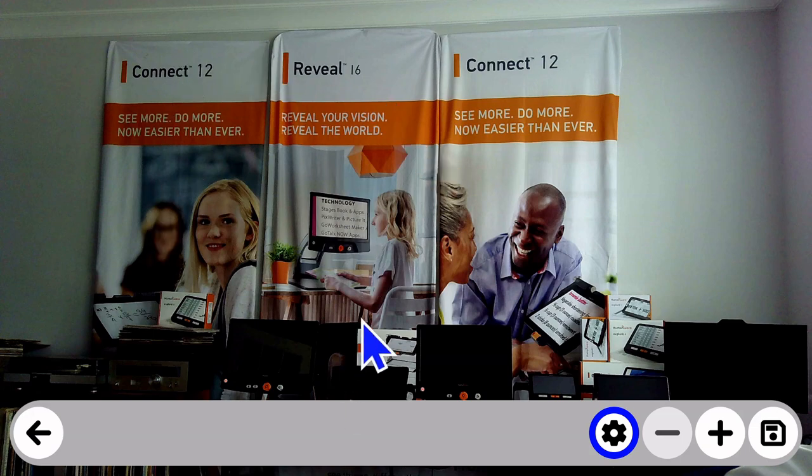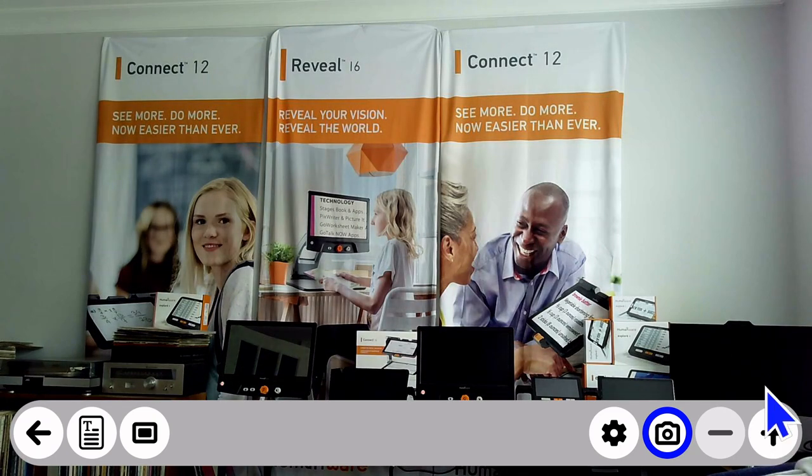Lastly, once you've frozen an image, in the lower far right corner is that little diskette, if you will, for those that have been using computers for a while. If I click on that one time, we'll go ahead and save that image and then go back to our live view. So very quickly, let's take a look at where that image went.